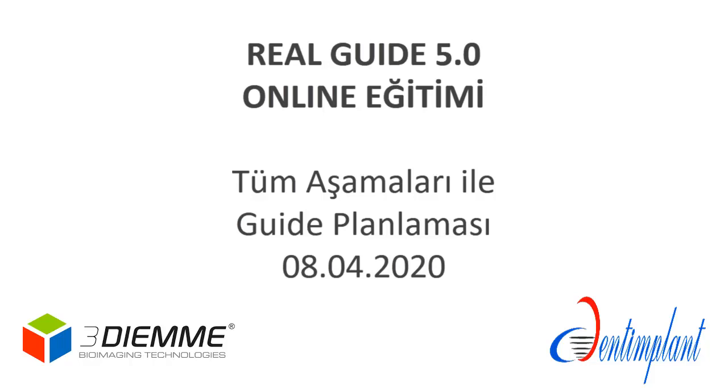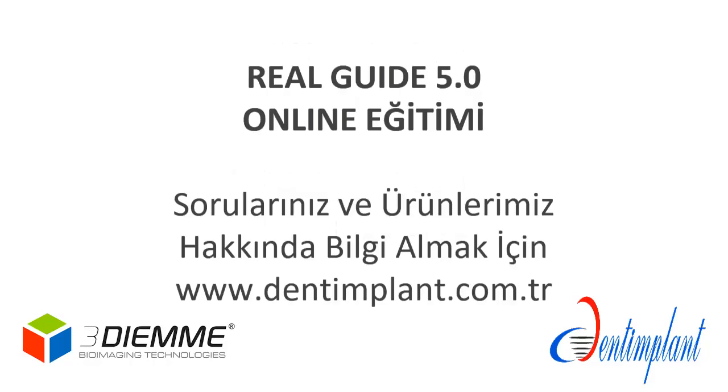My name is Luca and I am one of the 3DM biomedical engineers, and today we'll show you our Real Guide software suite. So we will explain all the different types of modules that Real Guide has, and we'll show you how these modules work. And then I will show you with my colleagues.